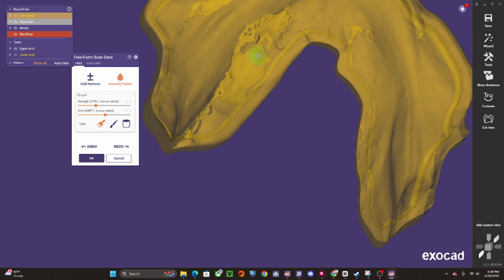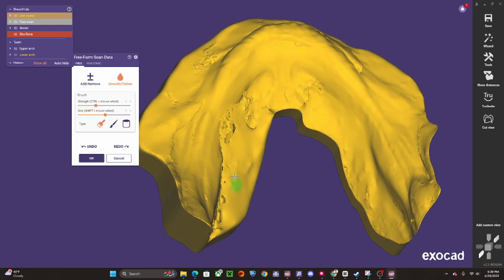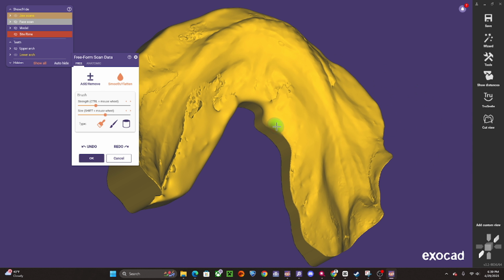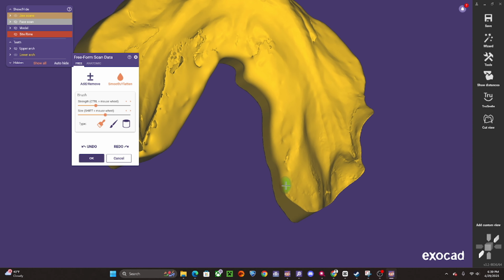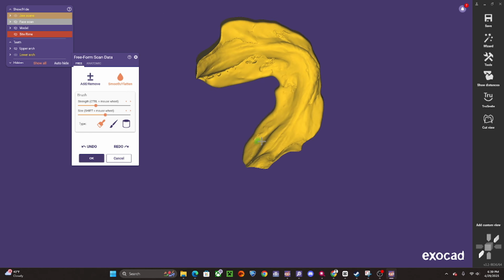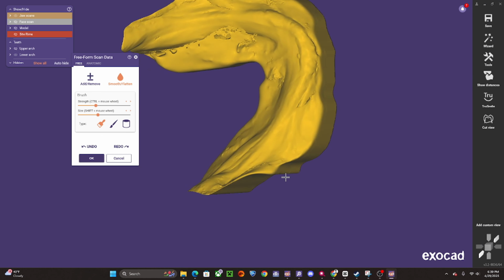Now this data right here is a little bit double stitched, but we will kind of ignore that for now, and I'll clean it up for you guys right here, so you don't have to deal with that.